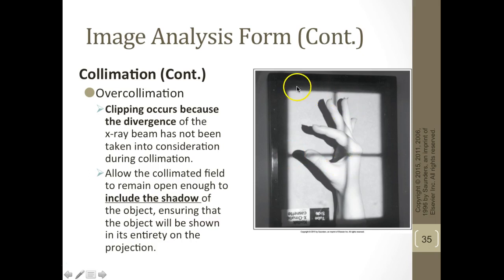So here is a right lateral hand. I would stick my marker right here if I'm looking for a marker placement. I do not like it on the medial side. If you're at UCSD, yes, you're going to put it over here or down here. There's a natural spot. I don't want to see you opening up your collimator field to get your marker on. So there's places to put it. If you're at UCSD, you can put it right here. So there's room, and there's also a natural spot right here.